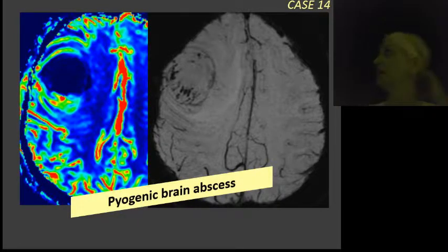If you don't see it, it doesn't mean that you can exclude bacterial brain abscess, because all the other sequences were fitting to bacterial brain abscess, and this patient was drained also.